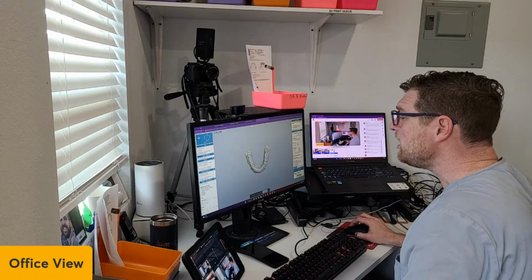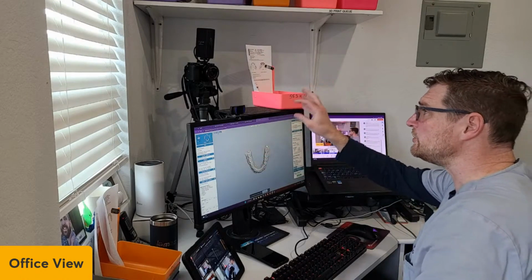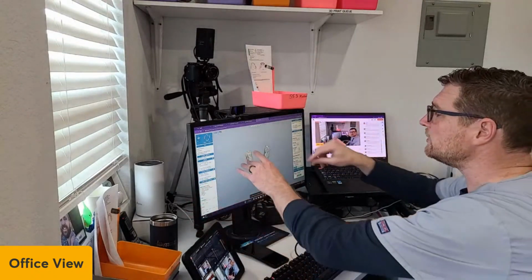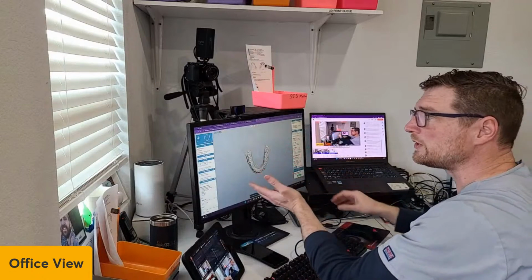But you're actually just seeing a preview. This model exists on another server. So this server exists on Amazon servers or something. And you're making all these edits and then sending it to the server, and then it's showing you a preview of what it's going to look like.